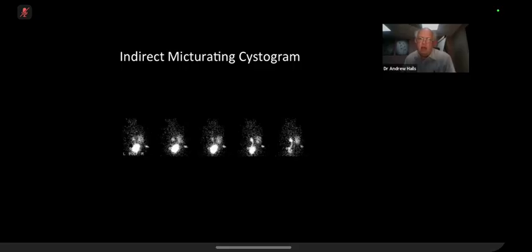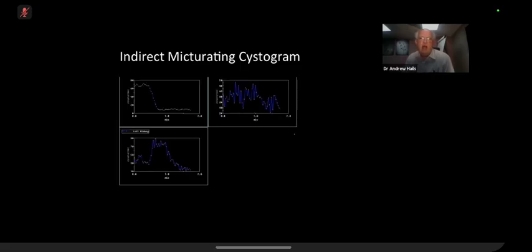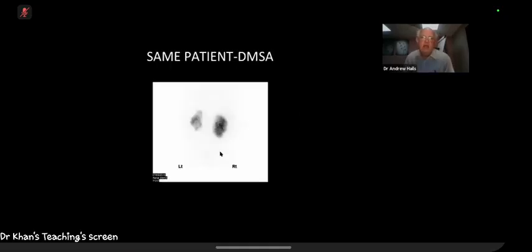That's right. Yeah, so the activity in the bladder goes down, the activity in the kidney goes up, and here we have the activity in the bladder going down. But as the activity in the bladder goes down, the activity in the left kidney goes up. In other words, you've got reflux into the left kidney. The right kidney is more or less the same all the way along. I think the way it's been drawn, if you notice it's 26 at the bottom, this in fact is much more constant than it really looks, whereas you've just shown there's definite reflux on the left side.